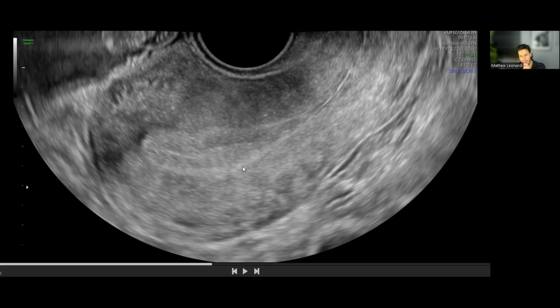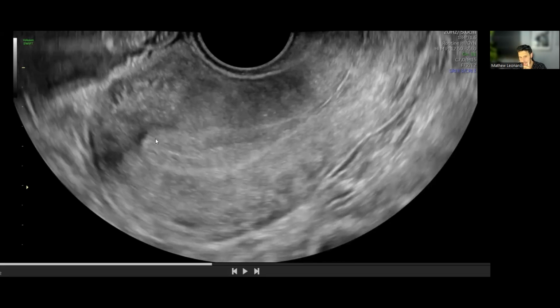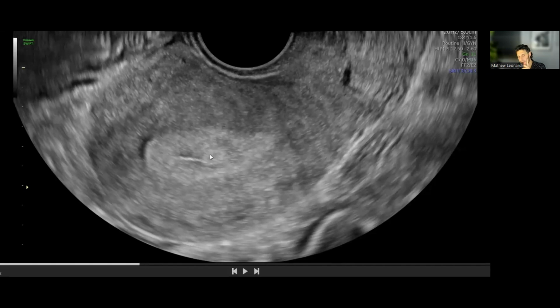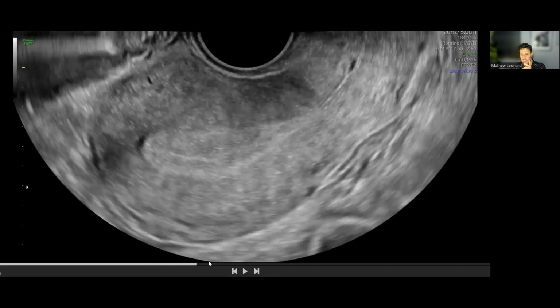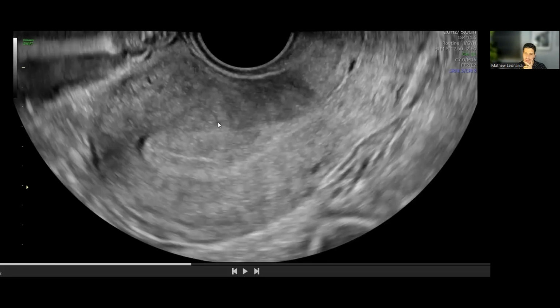So could this be another polyp right here? Not as clearly depicted with respect to the edges, but I am seeing a shift in that endometrium. Is that because there's a posterior polyp, or is that just because that anterior polyp has shifted that endometrium posteriorly, and then where it normalizes, we're seeing the return of where the midline linear echo should be? A bit unclear to me.